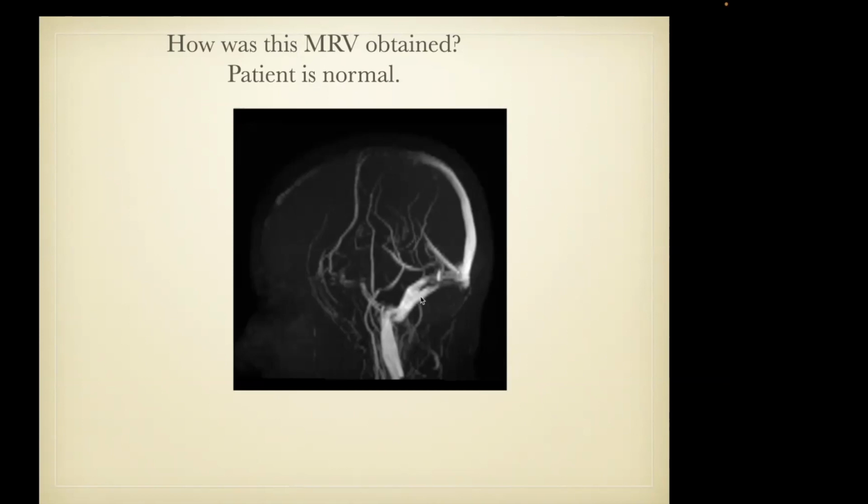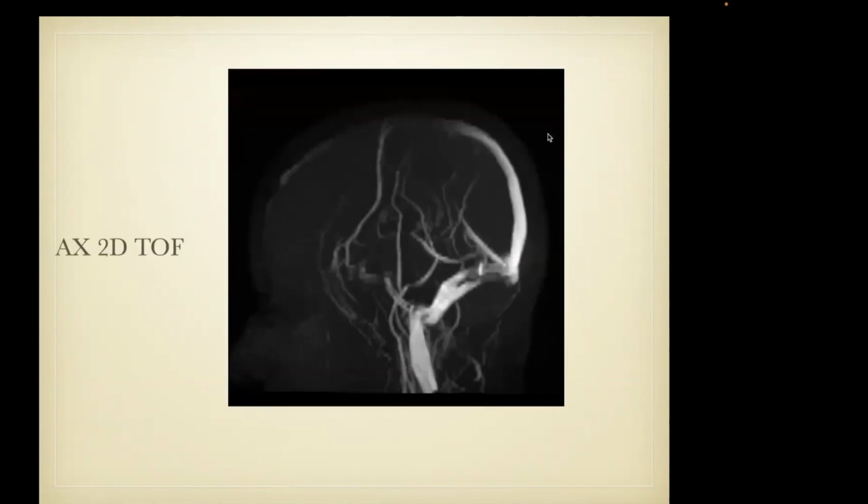Well, let's analyze this, right? So, maybe from up to bottom. Exactly, axial. By imaging in the axial plane, you have a choice, the technologists have a choice of picking the orientation. We maximize the flow in this portion of the sinus now and lose signal in this portion of the sinus. So the problem with MR venography is it's very directional dependent.